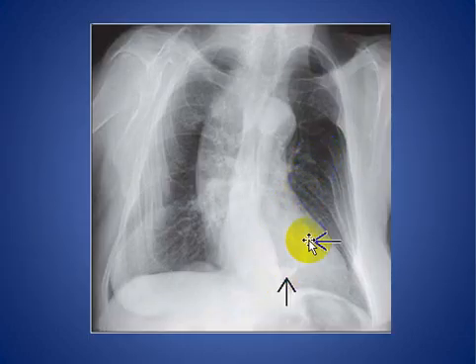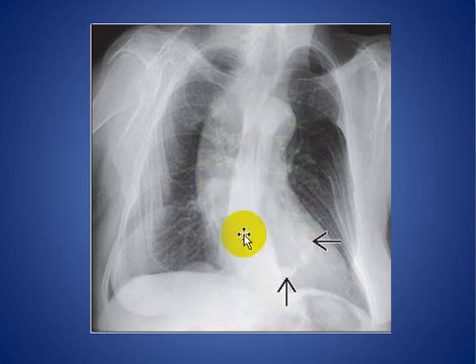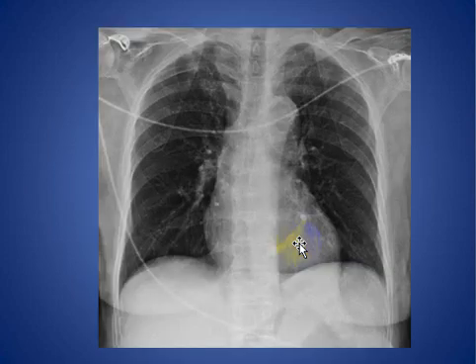And here we see a patient with a large heart with atherosclerotic changes of the aorta and annular calcification of the mitral valve. We see C-shaped calcification, and this patient has stenosis; it can also be asymptomatic or cause mitral regurgitation.